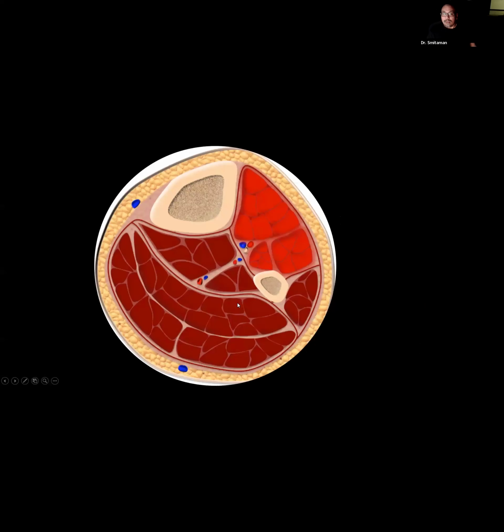Moving right along to that second category that I mentioned earlier, the edema and inflammation, and these next two categories are where we're going to be spending the bulk of our time. Increased signal on T2 or STIR imaging, okay, is the most common muscle pattern or abnormality that we see on MR, that indicates edema and or inflammation, as we know. In cases of atraumatic muscle edema it is especially important to correlate with history. I'm going to say that again.